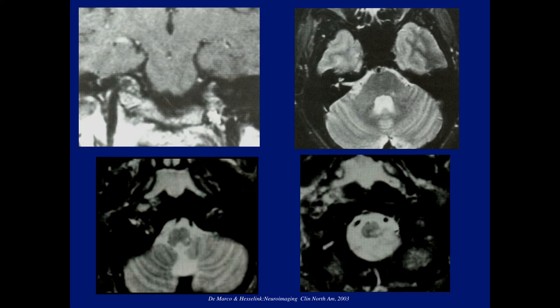Okay, what do we see here? Correct. As Eric pointed out, we see enhancement of the trigeminal on the left side. We see, as I discussed last week, involvement of the trigeminal spinal tract, involvement in the region of the medulla, high medulla, lower medulla.